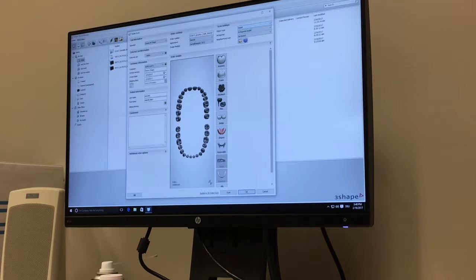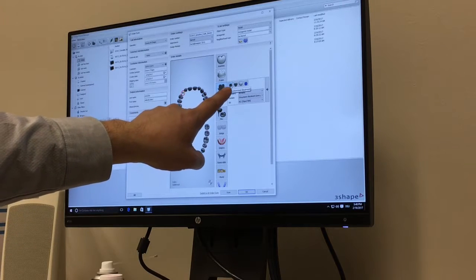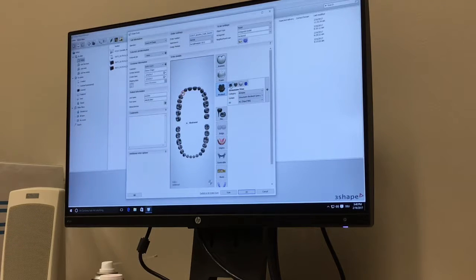Importance, normal, what's this? Okay, model, antagonistic model, and sectioned. Then you pick the abutment or the tooth number you want. Pick the abutment. You always have to go with customized abutment. Pick that. All items. Then you go to, you can go to, where is it?